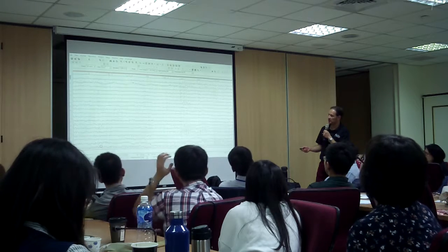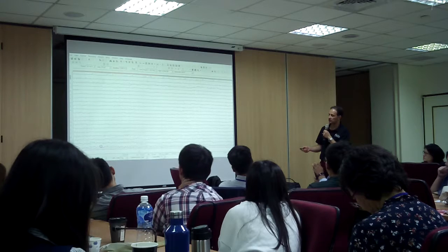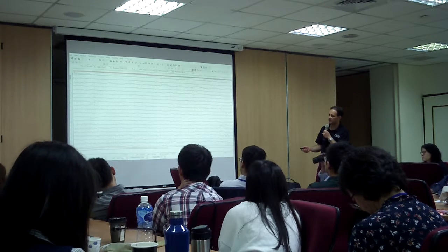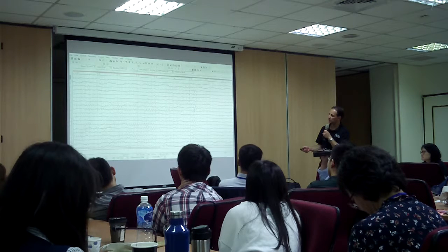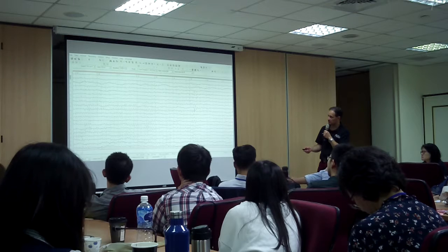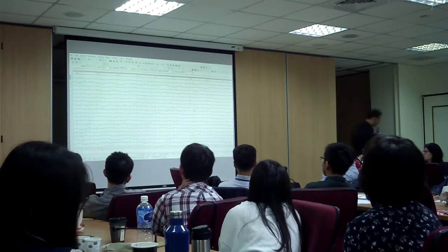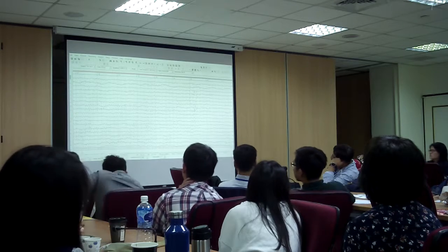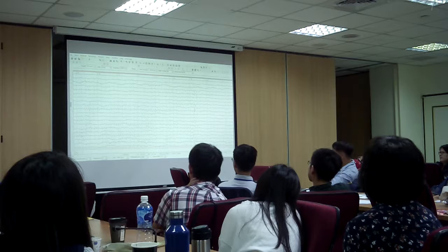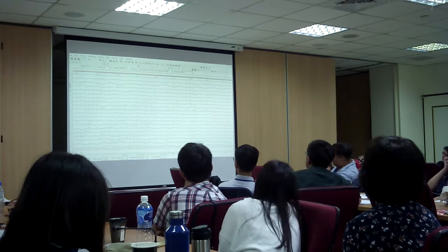Now I'm going to go back to the beginning for a second, and I want you to focus on this channel right here. Let me show you which ones. I want you to focus on this one, which is T3, this one, which is F3, and this one, which is F7.